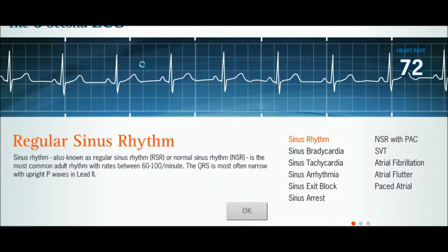So we go 1, 2, 3, 4 squares. So they're about 4 squares, I guess you could say. And you come over here, count 1, 2, 3, 4. They're good. 1, 2, 3, 4. That's fine with me.